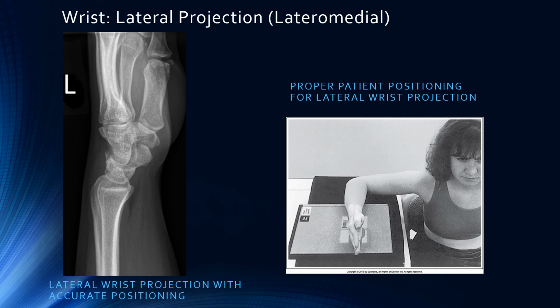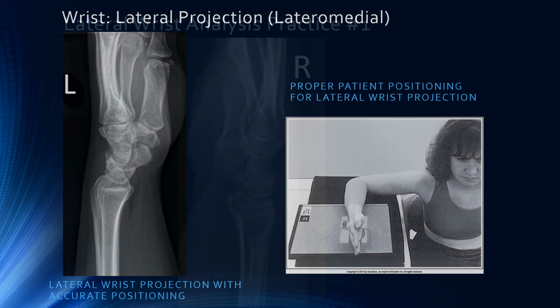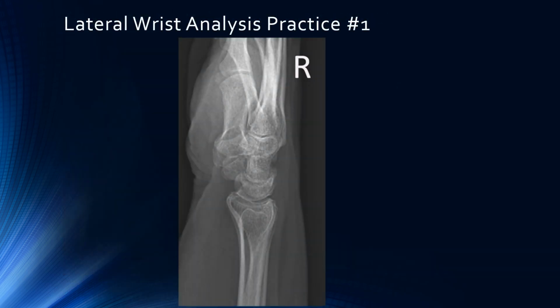Lateral projection, lateromedially. Here is an example of proper positioning and a decent x-ray. Lateral wrist analysis practice number 1. What do you guys think?